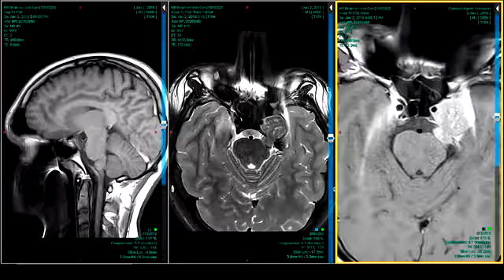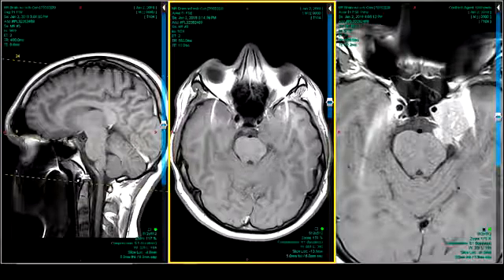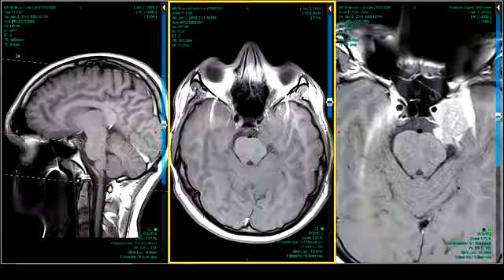And so coming early and staying late for the vascular enhancement, very typical for meningioma if this were to be one. Let's look at the T1 characteristics of it prior to contrast enhancement. I think we've got it right here. Kind of very bland, right? Meningiomas don't bleed. You know, they're firm, rock-hard lesions, as Dr. Schupek will attest to.